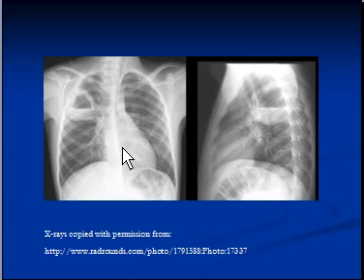It is not clear whether the X-ray is a PA view or an AP view, but it is very clear that the X-ray was taken in erect position. Also, there is no left or right marker on it, so we are using the heart shadow to assume that this is the left side and this is the right side. Again, assuming the patient does not have dextrocardia, in which people have the heart on their right hand side.